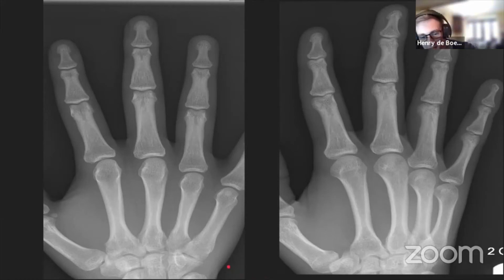Okay, so again, let's have a look through this one together. What we can see are the carpal bones, spaces look normal, tracing the outlines, no fracture, metacarpals, no fracture, phalanges, no fracture, looking at the joint spaces, the alignment, and then having a look at the bony detail, any bone lesions, less common in the fingers and the extremities than perhaps on a pelvis.